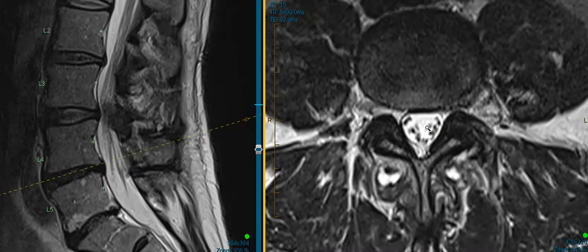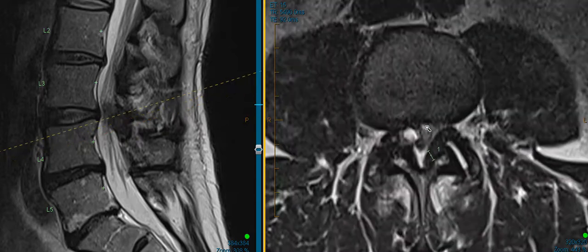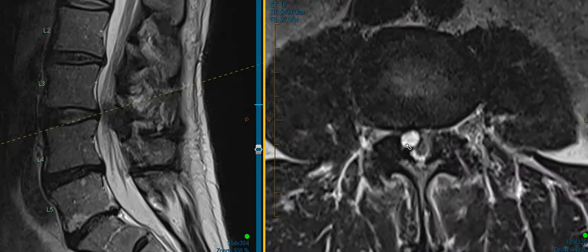So I'm going to move this cross-sectional line. You follow it. I'm going up to the L3-4 level here. And all of a sudden you see, wait, those little dots, they all converge, they come together, and they get kind of compressed into this little space here. Some big white thing right here, that's actually a cyst that's growing off of the joint, the facet complex on this is the right side. And he's got some significant arthritis growing off on the left side as well. So really something pathologic or problematic is happening with these joints.